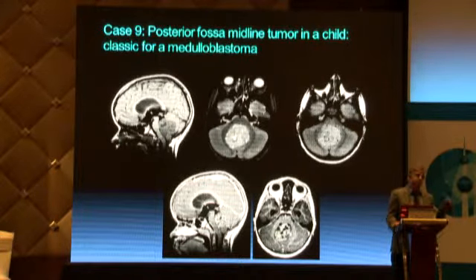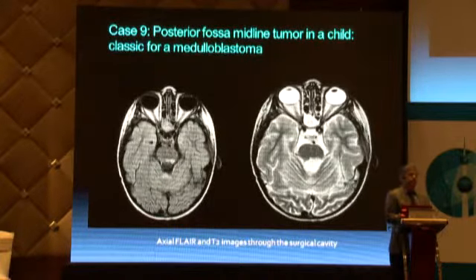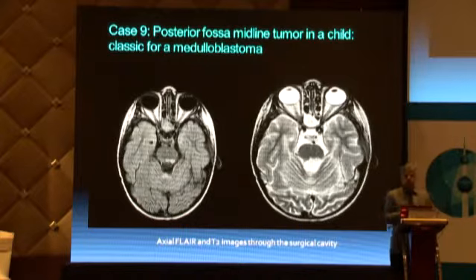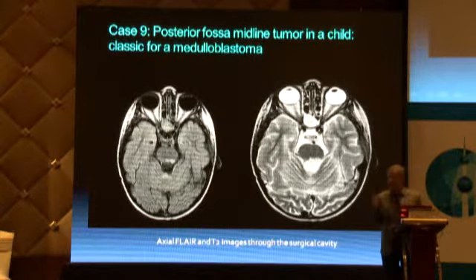So one of the most important things to do in the medulloblastoma is to go ahead, operate, and completely remove the tumor. If you have completely excised it and there is no tumor seeding along the CSF pathways, the prognosis is very good. The most important factor for prognosis is complete excision of the tumor. So neurosurgeons now really go at these tumors very aggressively. So look at this neurosurgeon, he did a great job. He's completely excised it, even gone up chasing the tumor up to the superior cerebellar peduncles. You can see the superior cerebellar peduncle on the right side, but not on the left side because tumor was extending there and he had to go after it. Okay, now why do you think I'm showing you this case?